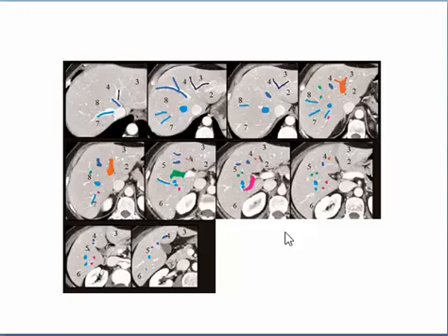So the level determines at which segment we are. And don't forget that at lower cuts you don't have 7 and 8, you have 5 and 6. The counting is from 5, 6, and then 7, 8.